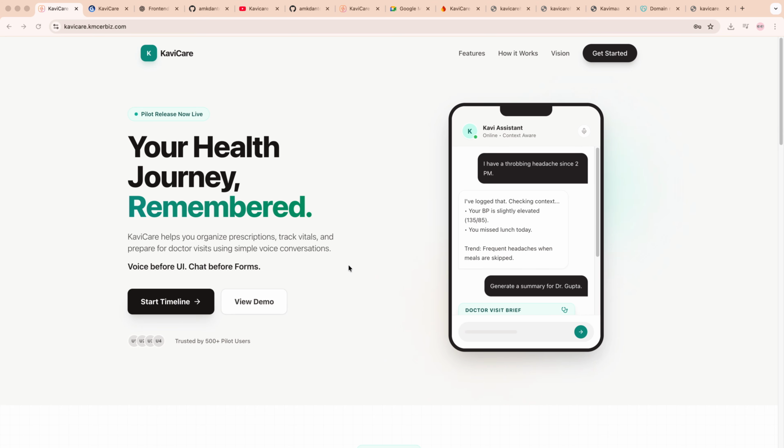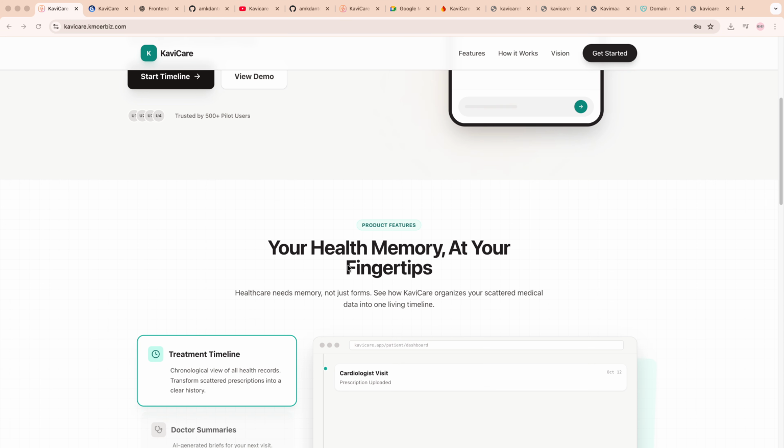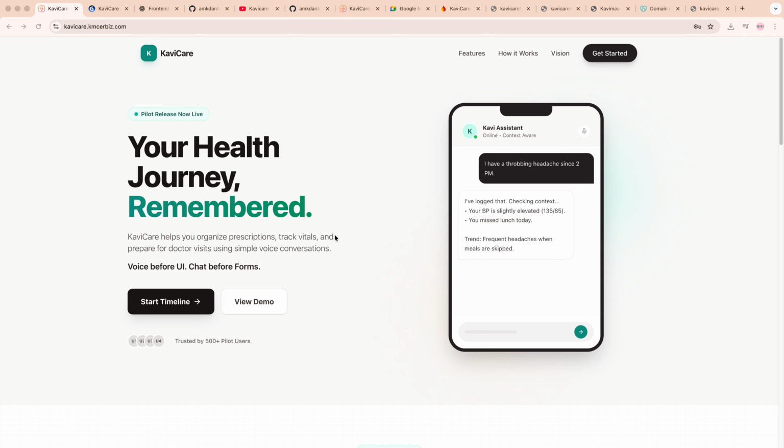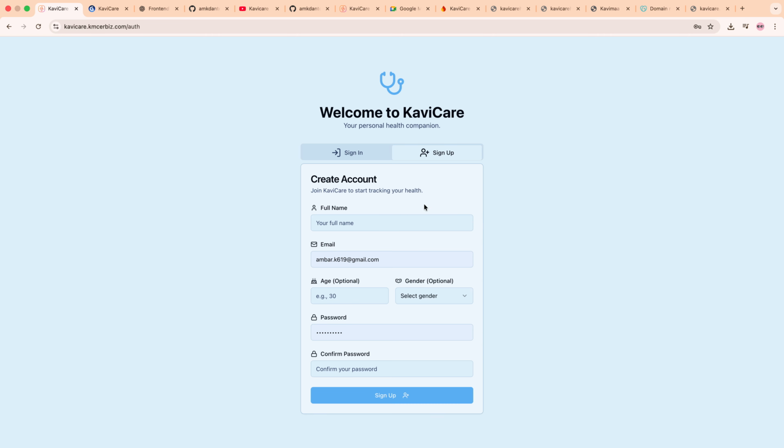We have seen what this app is all about. In this video, I will give a quick walkthrough of different AI flows. So let's get started with the sign up.